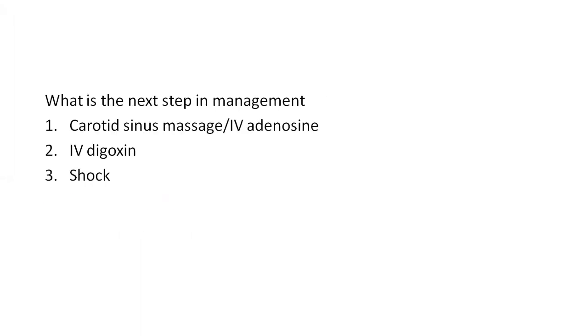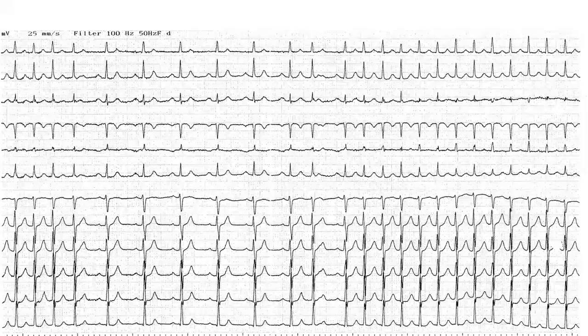What is the next step? You do a carotid massage or adenosine. And what are you expecting? You expect termination, and that is what is happening here. So you have a strip where you see tachycardia, adenosine, terminates, and then it starts again. But this is a clean termination.